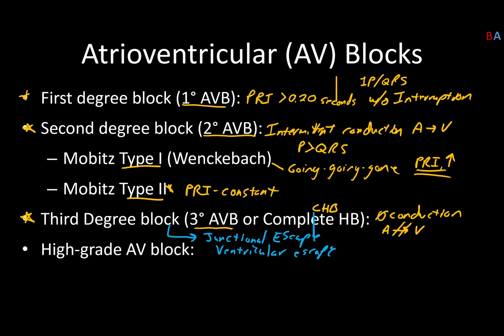And in my defense, just because it was the way I was trained, so I occasionally let this slip, I also call it idioventricular. And the idio means arising from. So you've got idioventricular, also known as ventricular escape. And that's what's going to be really important with this section. We're going to go through essentially the same strips and a couple extra that you did prior, but we're going to add in that next layer of identifying which type of escape rhythm you have.